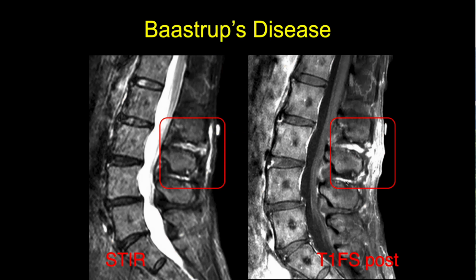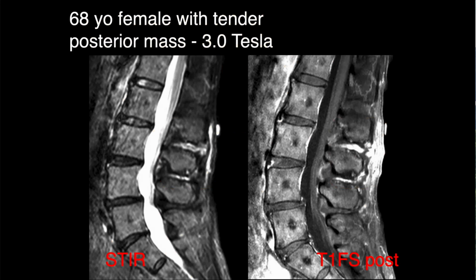I thought on the X-rays that we usually learn about, they're all kind of articulating with each other, right? Yeah, the processes can kind of hypertrophy.